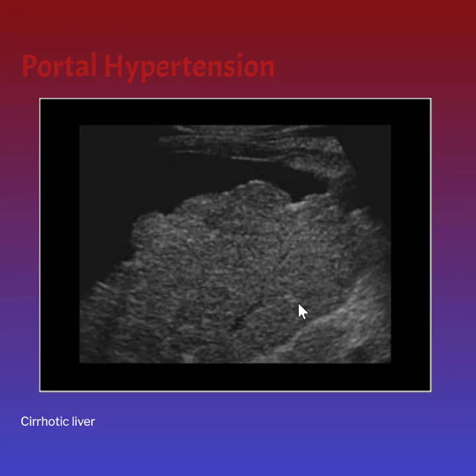All the pictures that you saw within the protocol do represent pictures that are of normal direction, of normal velocities. We just need to review again what some portal hypertension images do appear like. Remember that the cirrhotic liver is very common with portal hypertension, so we are going to see an echogenic, coarse, scalloped, edged liver, quite often surrounded by ascites.